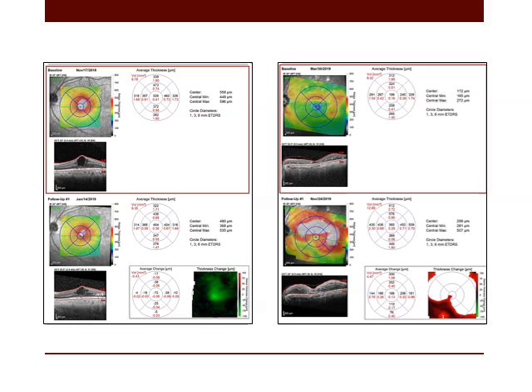It is also important for the instrument used to give you accurate follow-up with a tracking system. As in this case, we can see this is the baseline evaluation with its date, and the follow-up evaluation with another date. This is the thickness described in the baseline evaluation. This is the thickness in the follow-up revisit following treatment, and this is the difference in the thickness between the 2 visits.